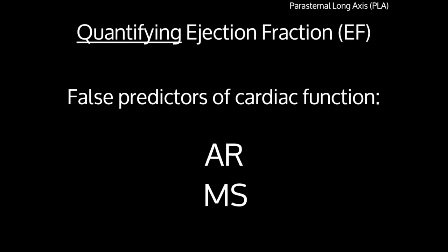Or, if your patient has mitral stenosis, the poor excursion of the mitral valve leaflets will give you a large EPSS, falsely predicting cardiac ejection fraction.